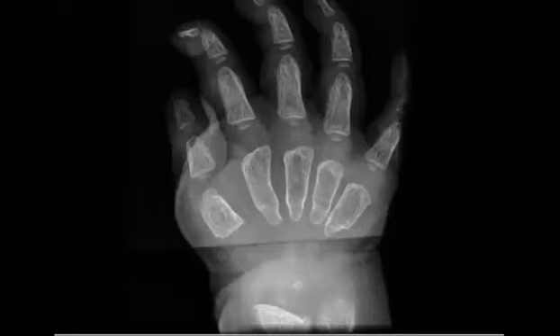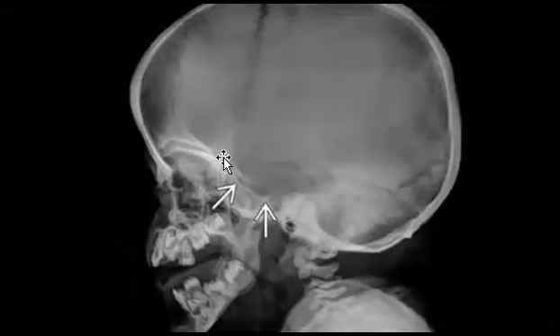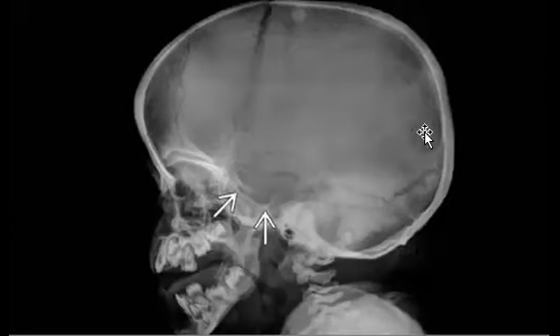So just one criterion, if we saw this appearance, it is what is called J-shaped sella, and you can see that there is even some macrocranium and dolichocephaly. Okay, it is a differential diagnosis. Marwa, frontal bossing as well, yes.